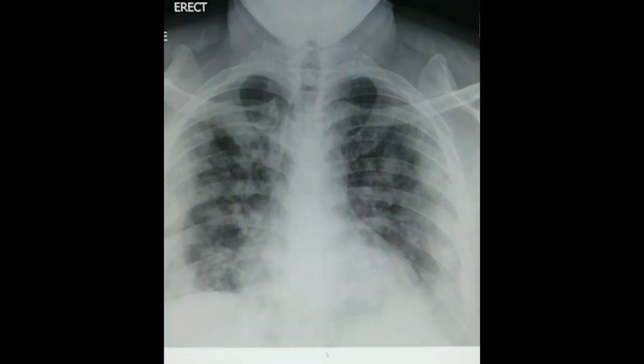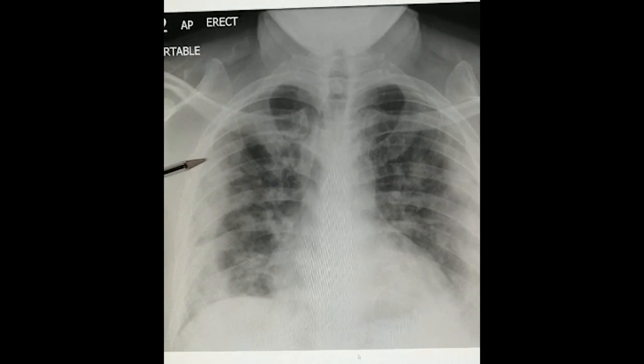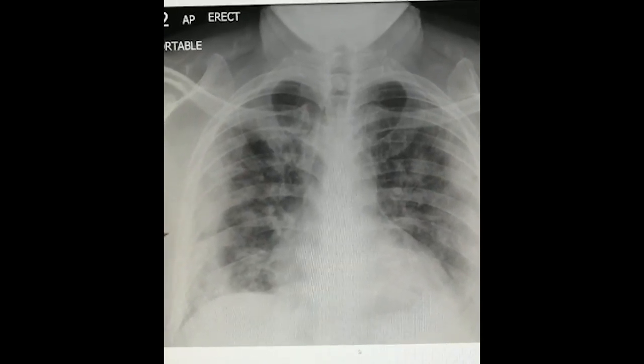Okay, so moving on now to a classical coronavirus case that we've had. This is a 68-year-old man. And what you can see here is the peripheral patchy consolidation in the mid and lower zones, obscuring those nice rib markings that we saw on the previous x-ray.